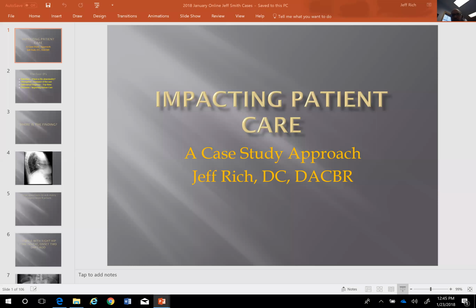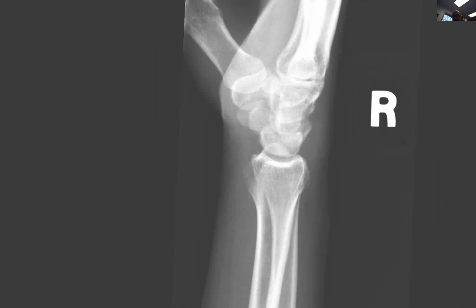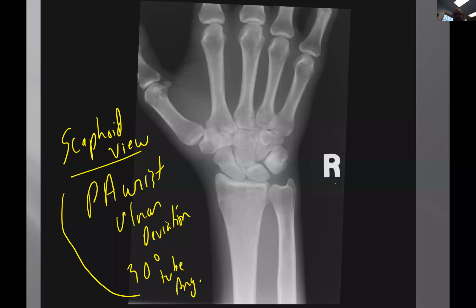See that? I'm like, what in the world? There's a cortical offset there. So if I go back, that really lends credence to the fact that, yeah, there's a fracture through here. I thought that was pretty dang subtle, but I'm pretty convinced of it.